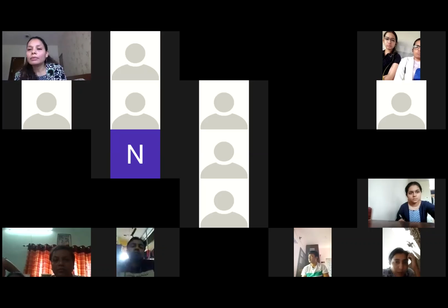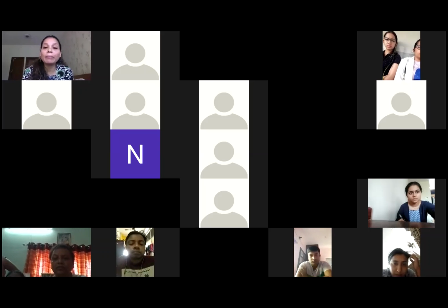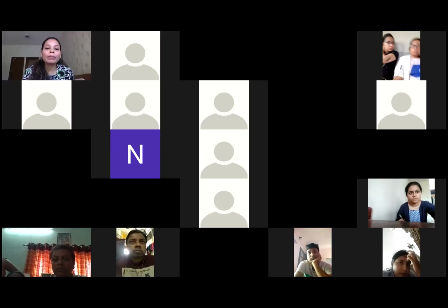Then Dr. Gurucharan Singh is mentioning in the last case, should not the field defect be continuous with the blind spot? Yes, so it could be, but it's not always that specific. You do not always get the same kind of appearance as you would expect. So it is very surprising to know that just getting a central scotoma that is also restricting to the vertical and horizontal meridian is very, very unusual. But when you get a situation like that, you need to also think out of the box.